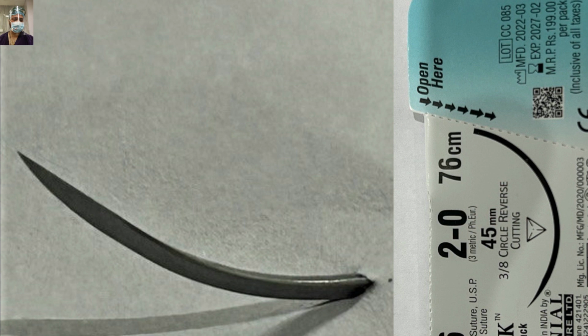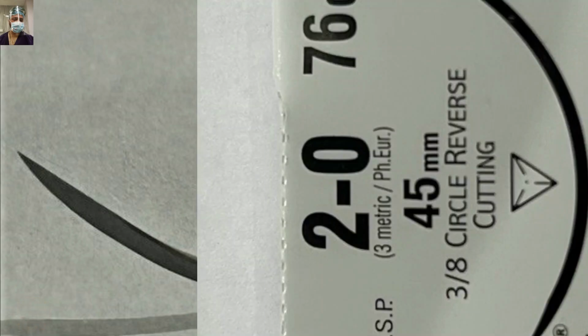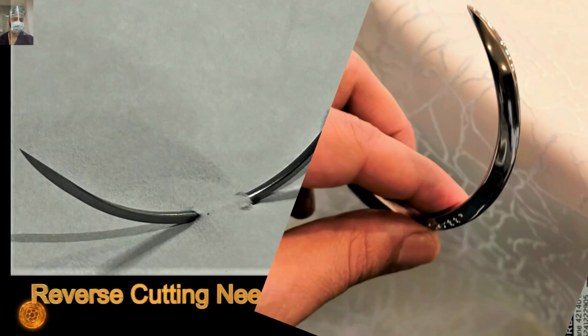As far as the coding is concerned, this is the 2-0 silk suture, and this will be a reverse triangle. So the cutting edge is toward the outer side, and as I said, you have to see that the cutting edge is not the whole needle. It is only the last part, usually one third of the length of the needle. The rest is normal flattened. And the 45 written here is the length of the needle shaft, and 3/8 is the part of the circle they have used in this needle.